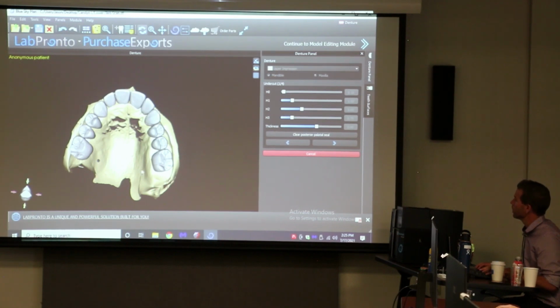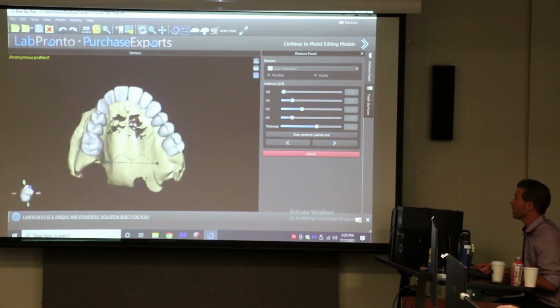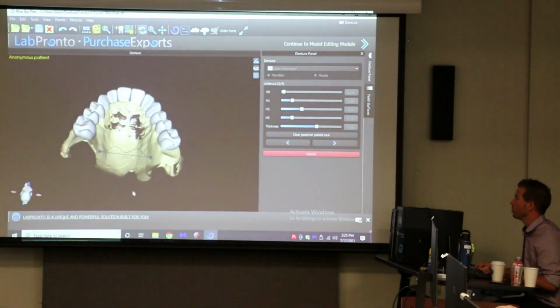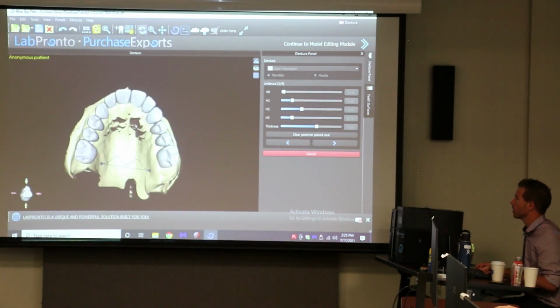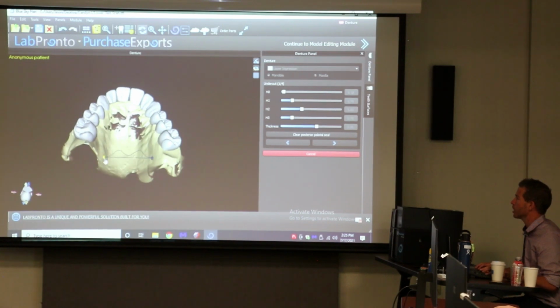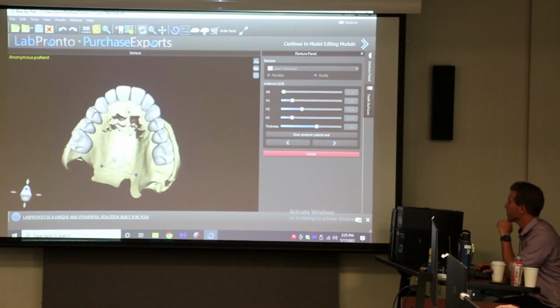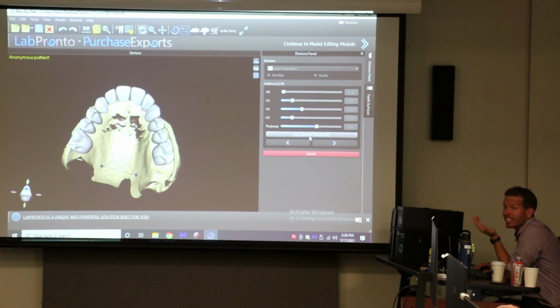And if you're strong in this area and you want to teach us stuff, go for it. But you have the ability to actually create that just like a denture lab would do. You can sit here and actually create some sort of posterior palatal seal. I never do because I'm relining them all anyway. So on an immediate, yeah, exactly. So we're not doing it.